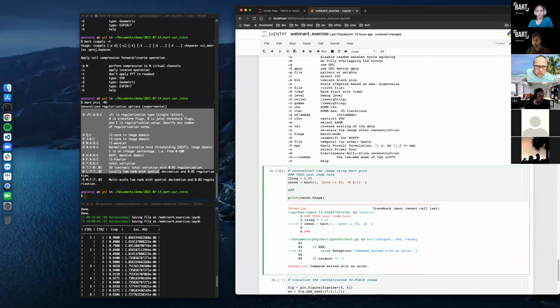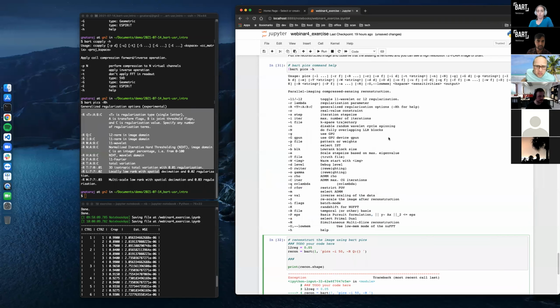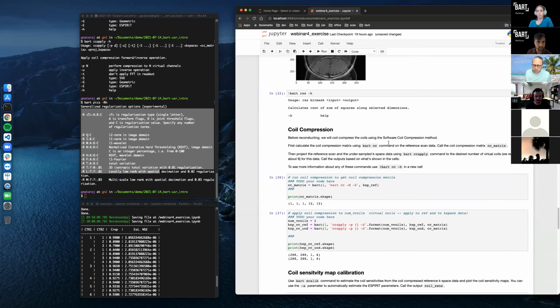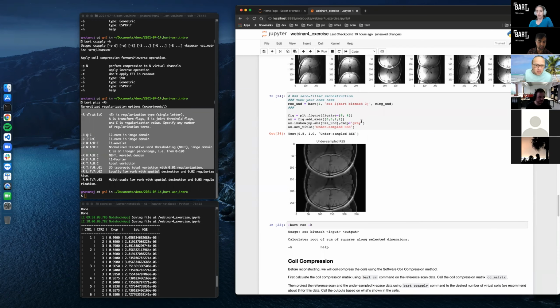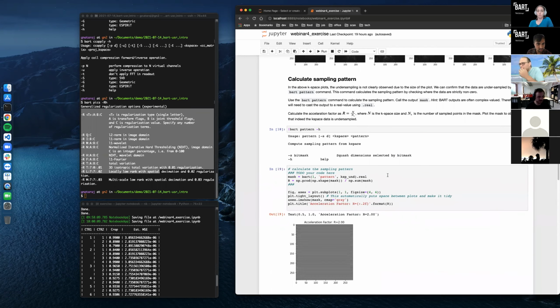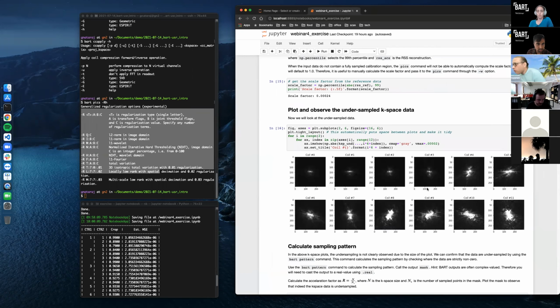And then 2 inputs. So there's one other thing, which is that, remember we calculated the scale factor up here? We need to specify the scale factor to get a reasonable reconstruction with regularization parameters between 0 and 1. And I realized that we didn't discuss that before, so there's absolutely no fault of yours. I'll just pull it up.